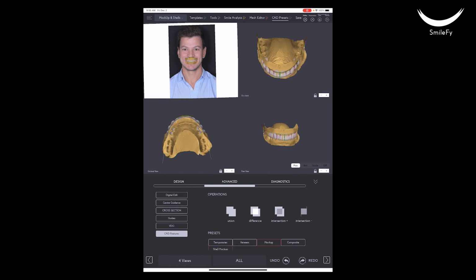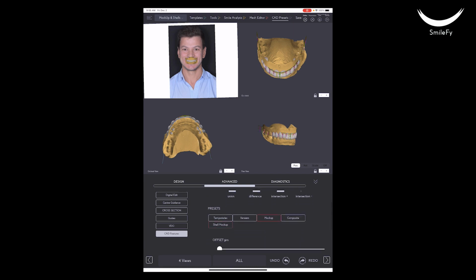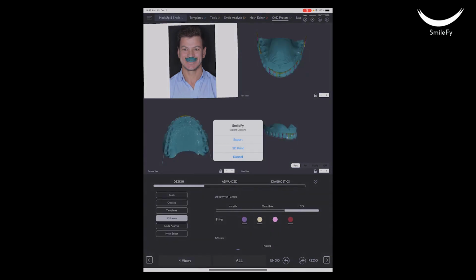Once you are finished with the dental wax-up, you can export the files. Notice that the lower STL will always appear as long as you add it, and it will be in occlusion to facilitate your teeth position. And to export the file that you just created, simply tap on Dental Mockup to export a print-ready dental wax-up for you to perform your wax-up trial.